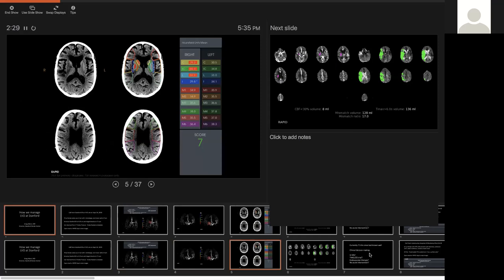And then this is an automated ASPECTS score. Particularly at 4 a.m., it's very hard to do an ASPECT score because your vision is blurry and ASPECTS are pretty subtle. So we can see that there is some early infarct changes in the deep areas. And you can get a low ASPECT score if you have small volume regions involved. If you had added in the insula and one M1 segment, this patient would not meet AHA criteria, but still has a small infarct volume. So again, we're not as interested in the score as the volume of tissue that's irreversibly injured.